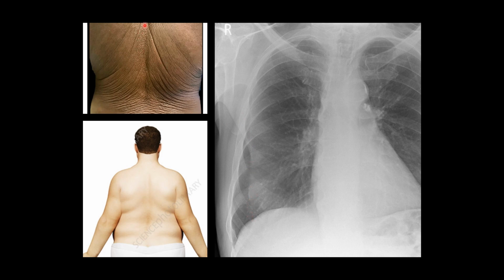Sometimes it's because of wrinkly skin, perhaps in an elderly patient or perhaps in someone who has lost a lot of weight. Other times it might be the skin folds in an obese patient, and very frequently it can simply be because something was shoved up underneath the patient, perhaps the cartridge itself, and that can wind up causing a crease in the skin that can register in this way.